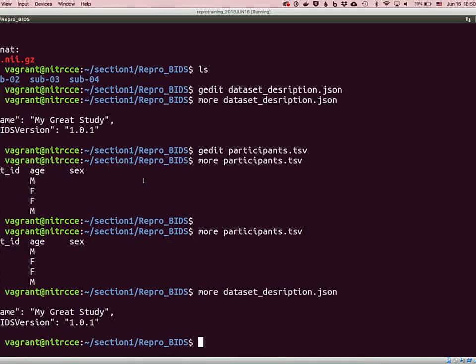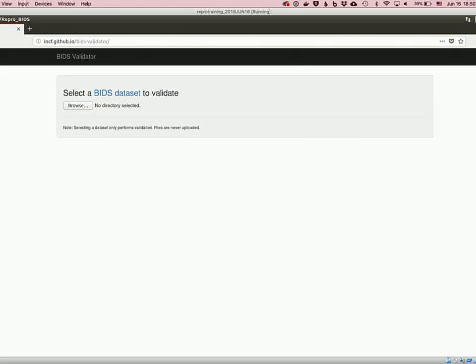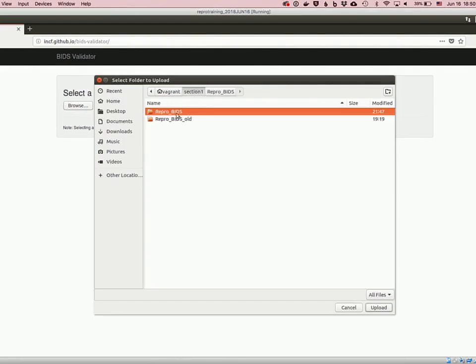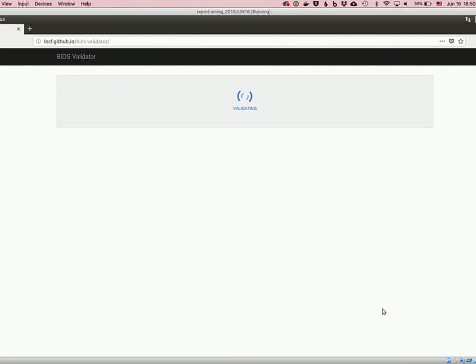Okay, so does anyone know how to get me out of this? Oh, there we go. Okay. Browse. Section 1. Repro BIDS. Upload.